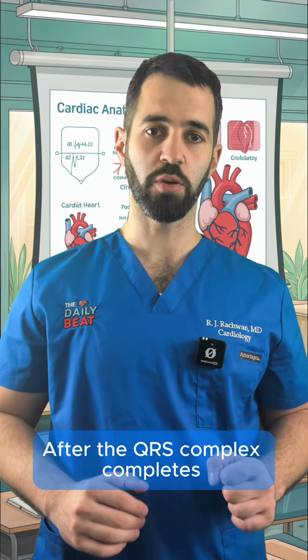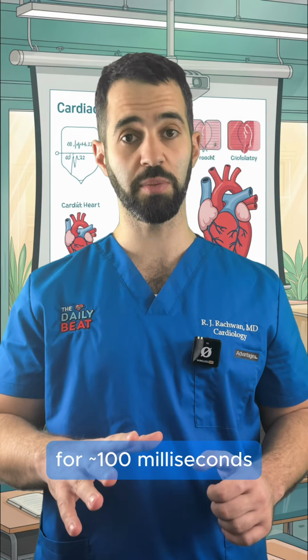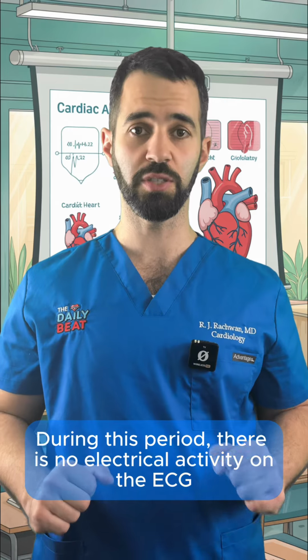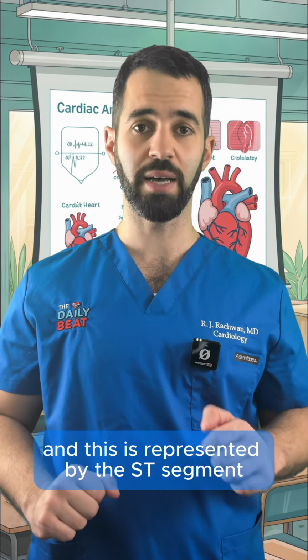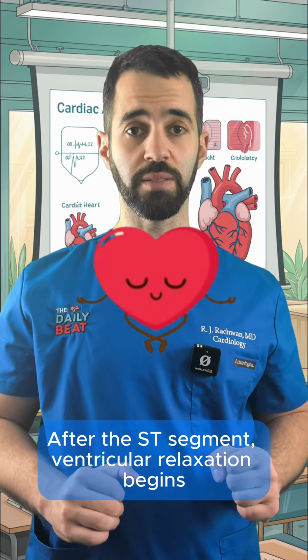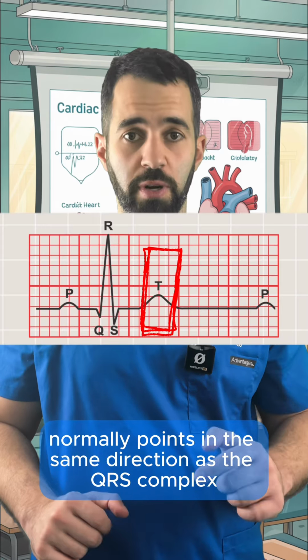After the QRS complex completes, the ventricle remains fully depolarized and contracted for approximately 100 milliseconds. During this period, there is no electrical activity on the ECG, and this is represented by the ST segment. After the ST segment, ventricular relaxation begins. This produces the T wave, which normally points in the same direction as the QRS complex.